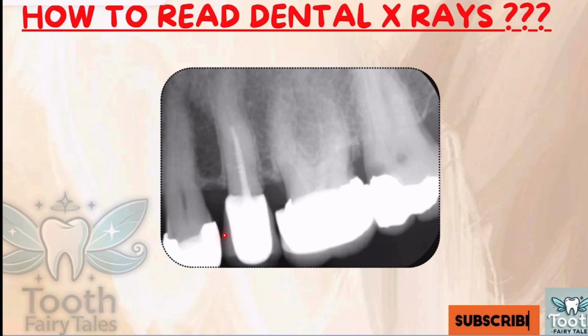This is the crown here, and you can see two shades here. One is the brighter and one is the gray shade. The brighter shade is the metal component of the crown, and the gray shade is the porcelain component of the crown. So this is called a porcelain fused to metal crown. And the teeth adjacent to it show fillings here.